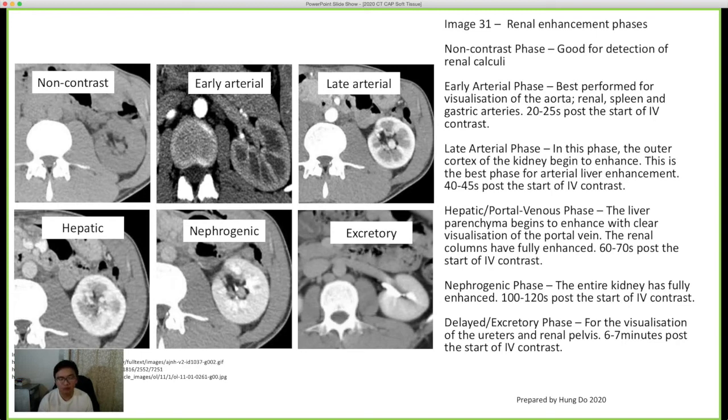When is this important? It's pretty much important for anything that is to do with bleeds, anything that is to do with liver resections, liver volumes, and those kind of things. If we wait too long and let the contrast perfuse the organ, it's too bright and it's very hard to sometimes differentiate small aneurysms if there's too much contrast surrounding these aneurysms due to the fact that we've scanned a bit late.